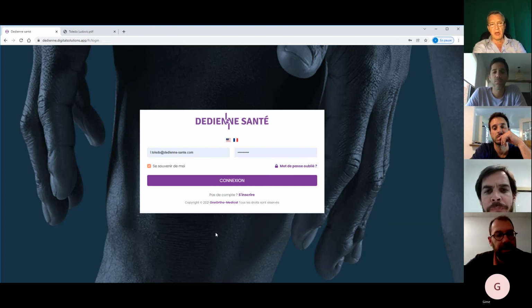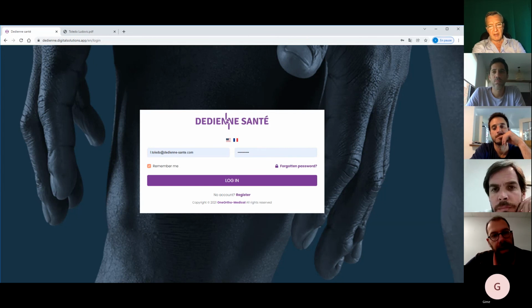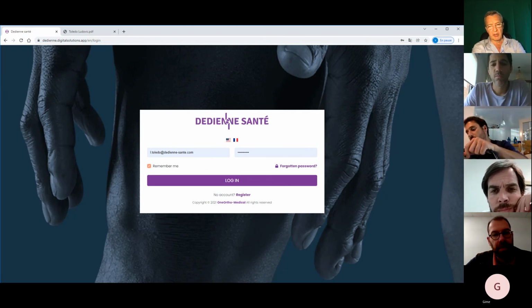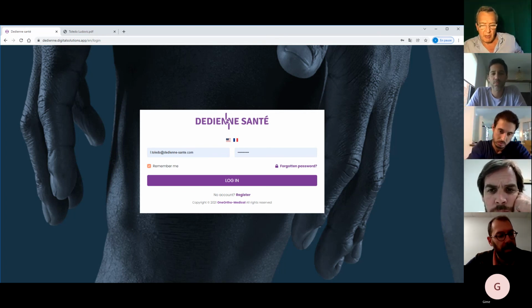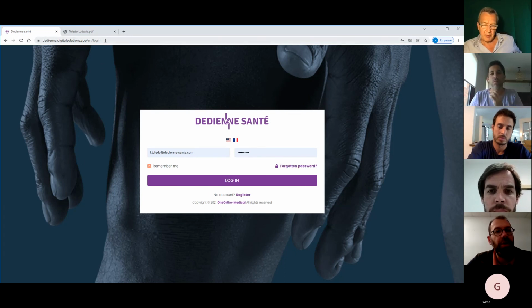So exactly, everything is on the web, on the internet, and then print the PDF to take it to the operating room. Or we can save some screenshots. Yes, Marcos, exactly. We can do some screenshots in order to have the information, because the information is not saved on our computer; it's saved on the website. Yes, exactly. We can download the PDF and take some screenshots to have them at our site.